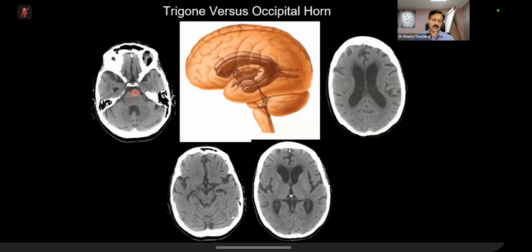And pons has got this belly. I call it the fat man. And this is the midbrain, which is the Mickey Mouse. So this appears like a Mickey Mouse. Now here, this is the cerebellopontine angle cistern here, and this one. This cistern is important for you vis-a-vis herniation.